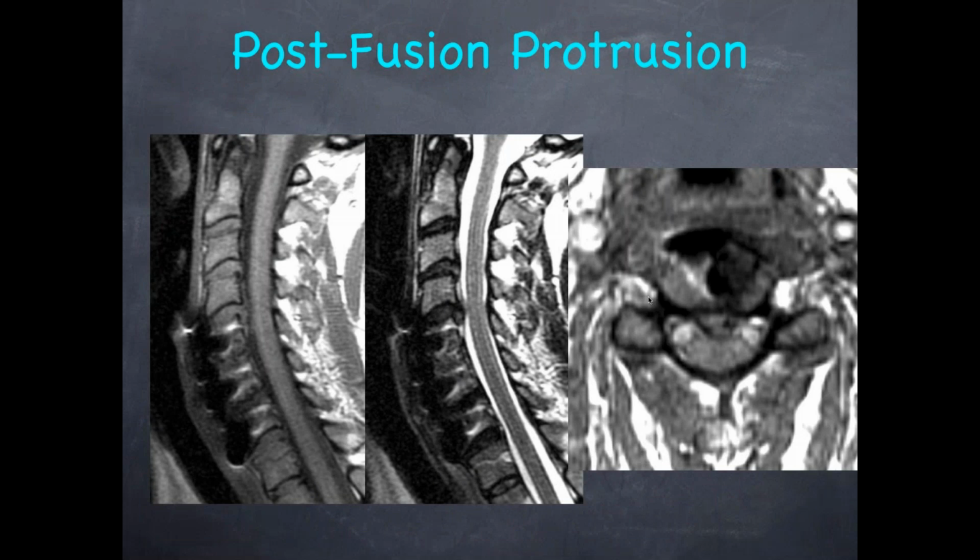So this focal canal narrowing by that disc, this postoperative changes, and oh wow, on the axial, there's a little, I guess, an extrusion, small extrusion there posteriorly. Yep. So it's a central focal narrowing of the canal. Extrusion. Yeah, okay. And it's abutting the anterior aspect of the cord, but at this level we don't see any cord changes. So this is right above the fusion, so it's an area of increased risk for stress and strain.